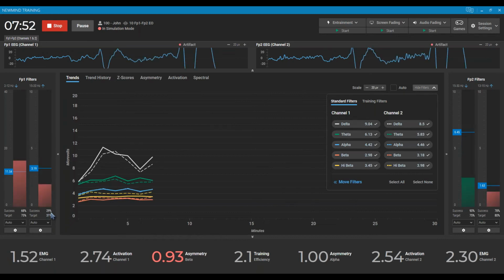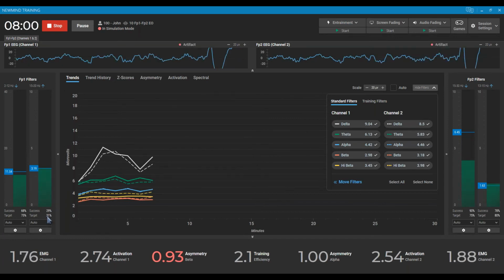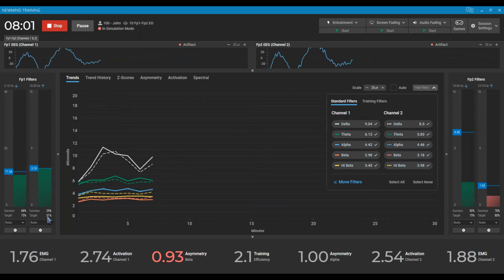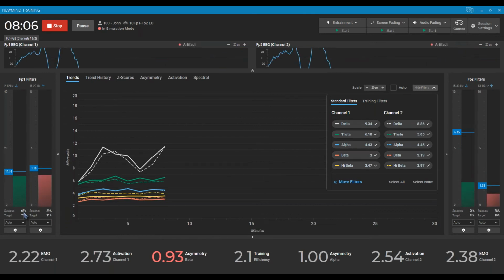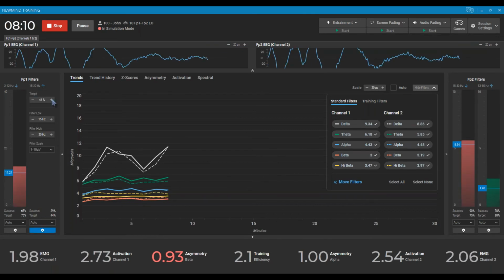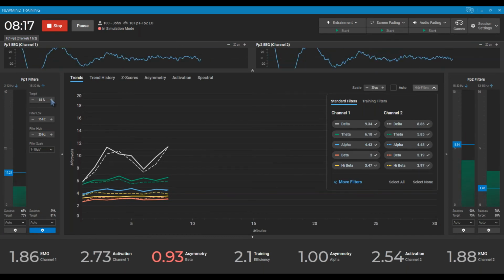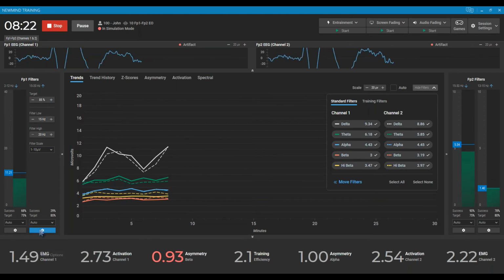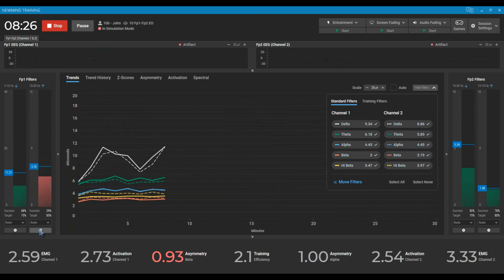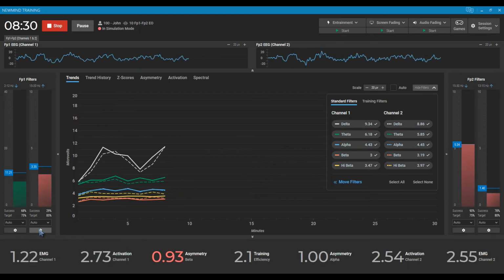So as you guys train your clients, like Rob said, you can watch these success percentages. If they're sitting low, you want to just raise it up. So the higher this target percentage, the easier you're making it on your client. The lower the percentage, the harder. So if I go up to like 85, I know Rob's a big fan of training up around more than the 85 range. Dr. Suter, his preference is more down at 75. There isn't a right and wrong here. Just keep that in mind. It's all about your client and what their brain's capable of.